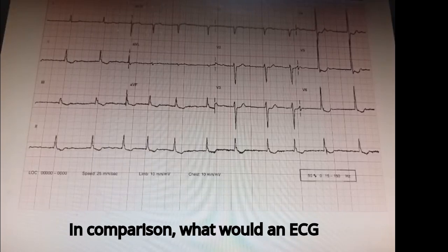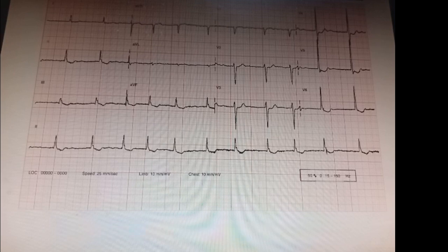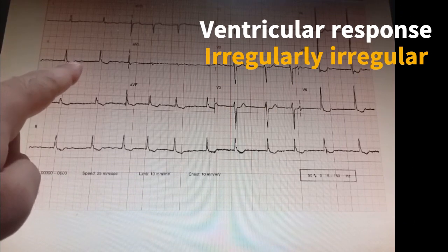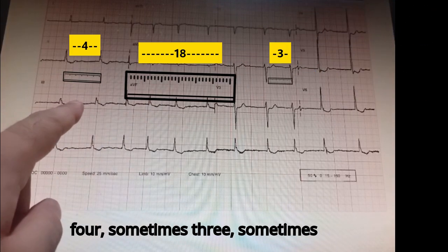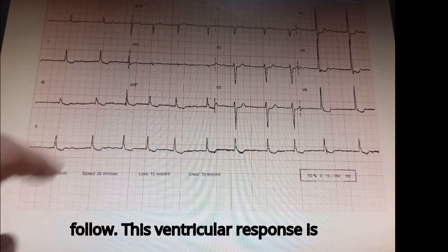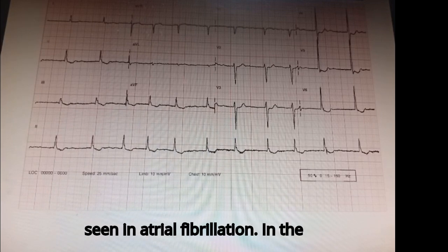In comparison, what would an ECG showing irregularly irregular waves look like? If you see this ECG strip, you will notice that not only are the number of squares changing, but there is no pattern to follow. Sometimes the number of squares is about 4, sometimes 3, sometimes 4 again, but there's no pattern to follow. This ventricular response is called irregularly irregular, and it is seen in atrial fibrillation.